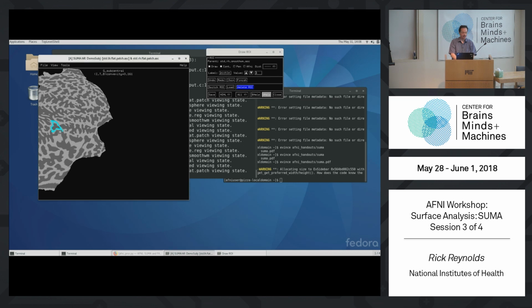One last step. Right now, the ROI is actually just the edge. That's all we've defined. You might want to actually save this edge as an ROI. Me, I want to include all the nodes inside here that I've trapped inside my closed circuit. So I'm going to make one last step and click inside. You can either right-click if you're not in pen mode, or go back to pen mode and left-click in the middle.